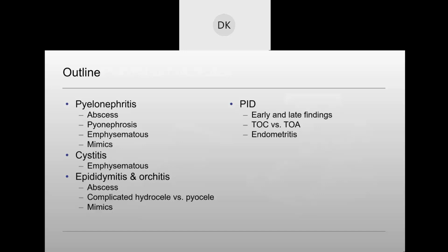All right, so just to quickly review, with pyelonephritis, only about 20% of cases will be positive on ultrasound, but you could use that microvascular flow to bring it out more. And the main complications we're looking for are abscess, pyonephrosis, which is an obstructed, dilated collecting system, and then a gas-forming infection. And if possible, try to differentiate between gas in the parenchyma, which is emphysematous pyelonephritis, more concerning and often goes to surgery, from gas that's just in the collecting system, which tends to be a less serious infection, which is just pyelitis. And then be aware of that scary lymphoma mimic, but it should have flow within it to differentiate from an abscess.